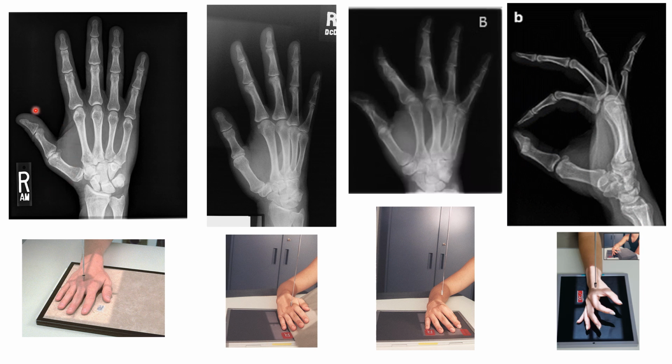Note that the first digit here, the thumb, lies at a natural oblique position with our hand in a PA position, in a pronated position. So the thumb is actually lying at a natural 45-degree oblique on our PA hand x-rays.